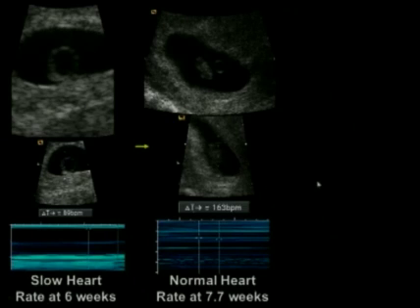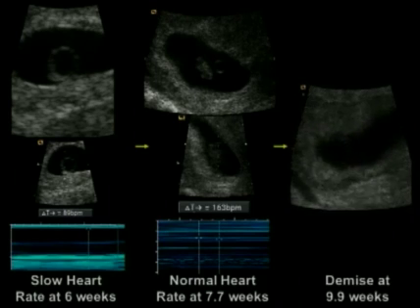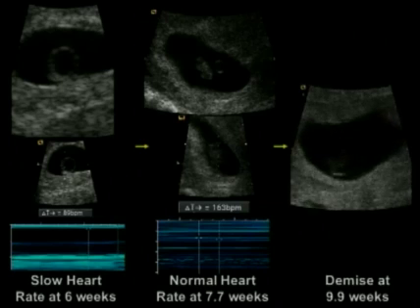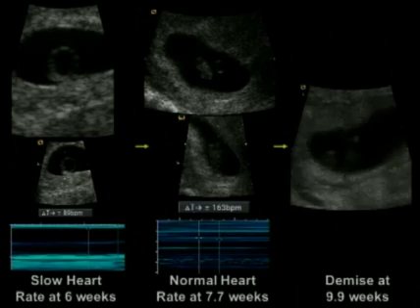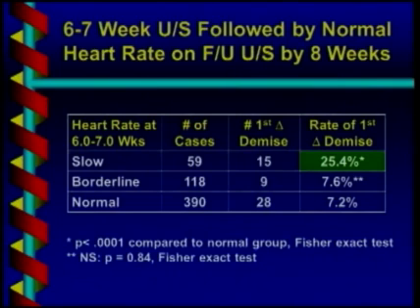Well, the answer is this worrisome finding, even when the heart rate's normal, her chance of demise is still somewhat elevated. And notice that at about 10 weeks, there is fetal demise. So unfortunately, when the rate is low on the initial scan, a follow-up scan with a normal rate doesn't mean that the chances are completely normal.